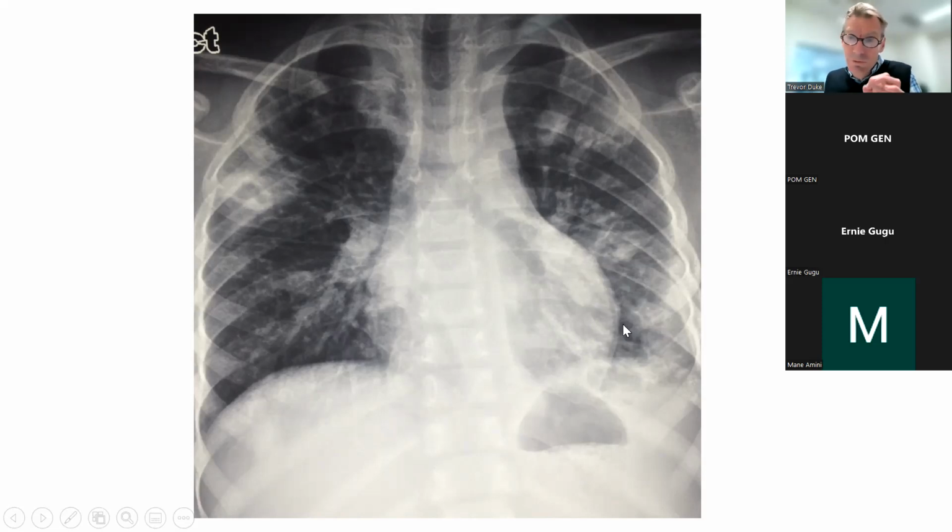It could be a little bit of lobar emphysema, but it could be around what you've got, the bronchi that seems to narrow down and then dilate up a bit. What would you think that was? Well, the bronchial tree always starts large at the trachea and then becomes narrower and narrower, just like a normal tree does.